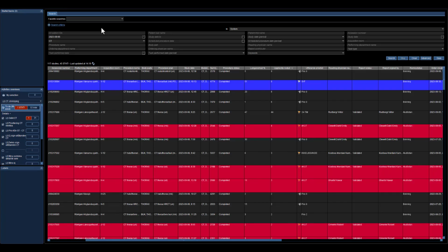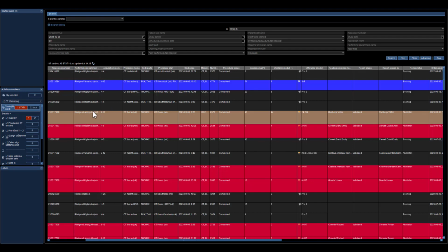All CT chest studies are automatically DICOM forwarded from PACS to the analyze server and the results sent back to the PACS. From this point, you will be able to see the anomaly percents in the pattern analyze and the number of nodules found before you click on the study in the task list of the PACS to review the images.